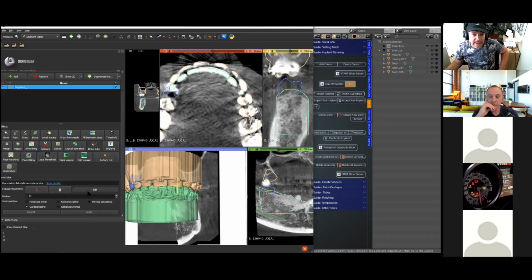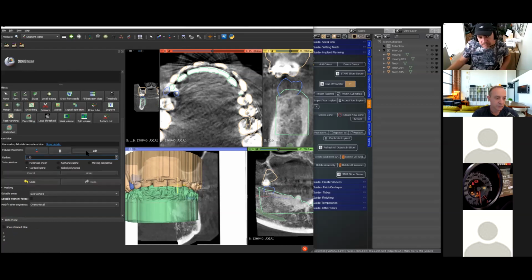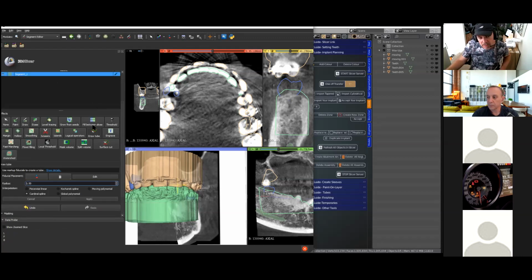We can export it to Blender, but we don't have to because we've got the visual over here. Okay, but if I do decide to export it into Blender, we can use the link. It's a very small object. So the way we do this is we have to make this into a model.